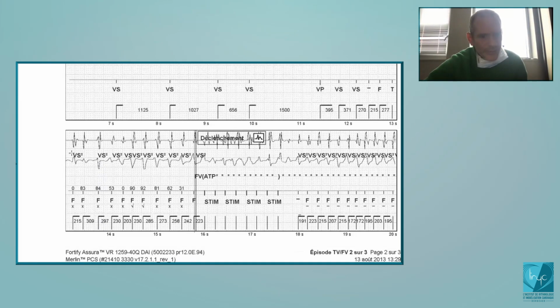Now I will try to explain, without entering too much into the details, how it works. In this channel you see the marker VS2. VS2 does not mean that there are two VS, but that you sense one cycle in the second channel of analysis, the discrimination channel. Something important: you will now sense in the discrimination channel.